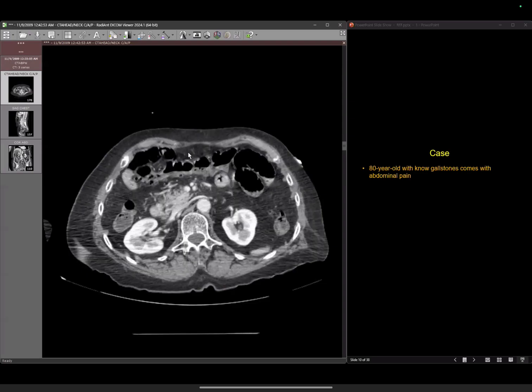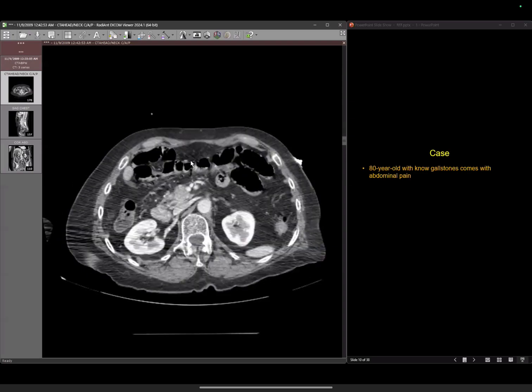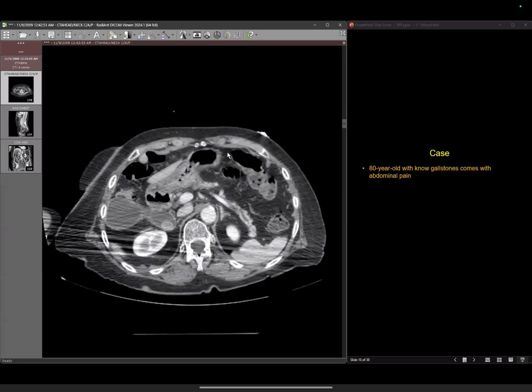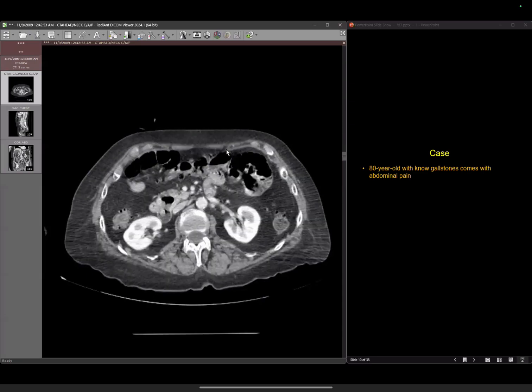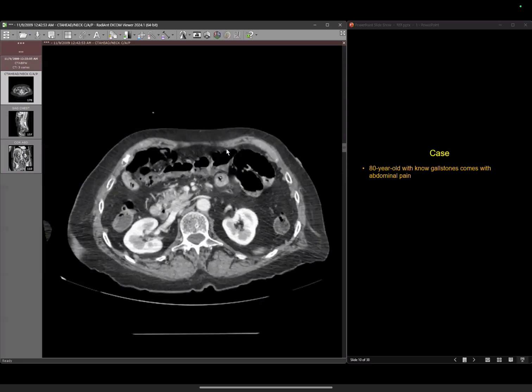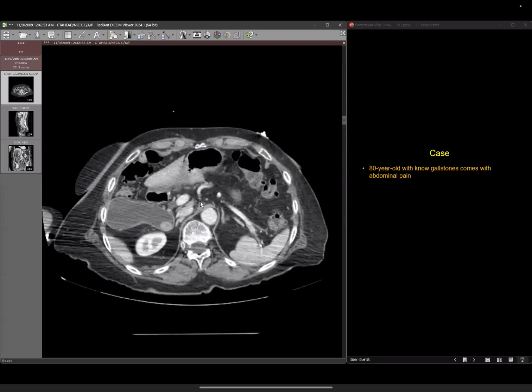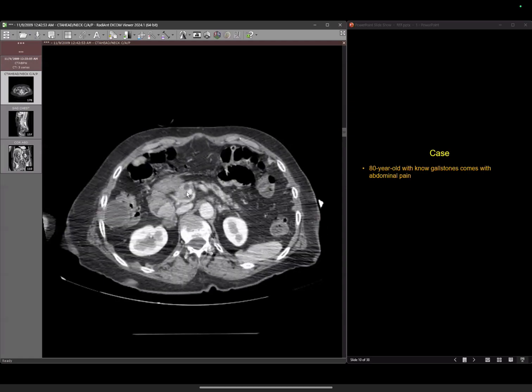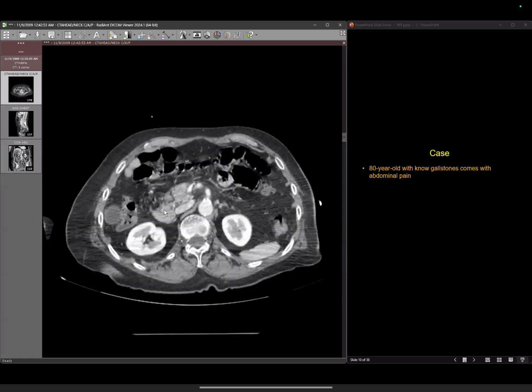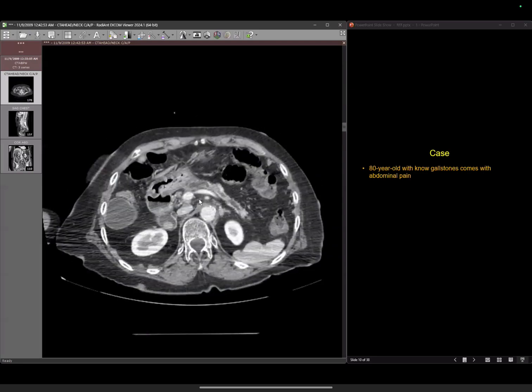So what are you suspecting? Yeah, you are absolutely right, and that's exactly the point of this case. But what are you suspecting? Sir, I am suspecting intraductal cholangio. Well, no, remember, you said there is dilatation of the pancreatic duct and atrophy, and there is abrupt cutoff of the pancreatic duct. There is no biliary ductal dilatation. Cholangio would be more along the bile duct.